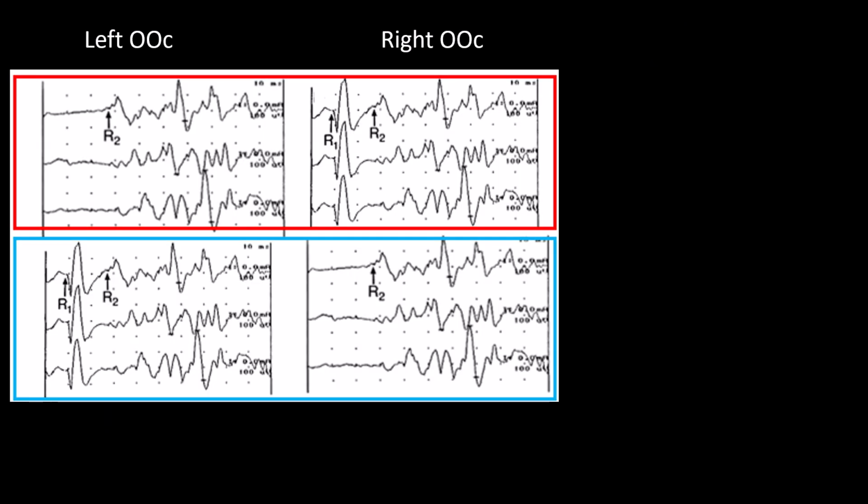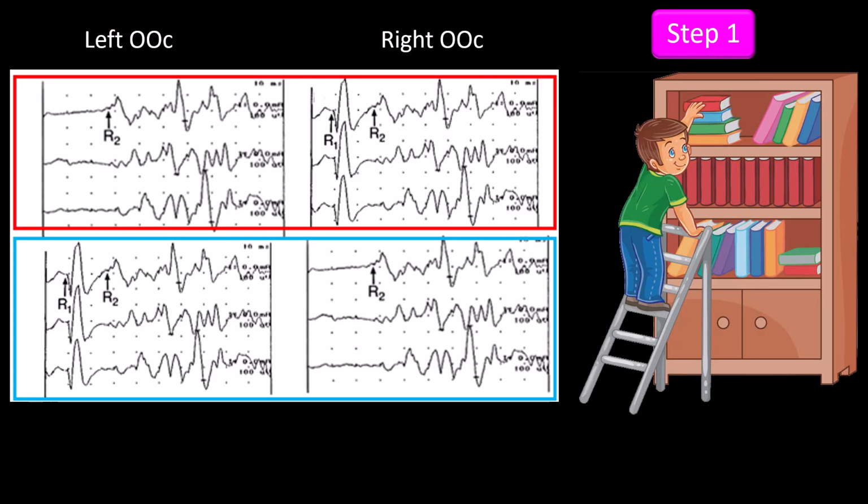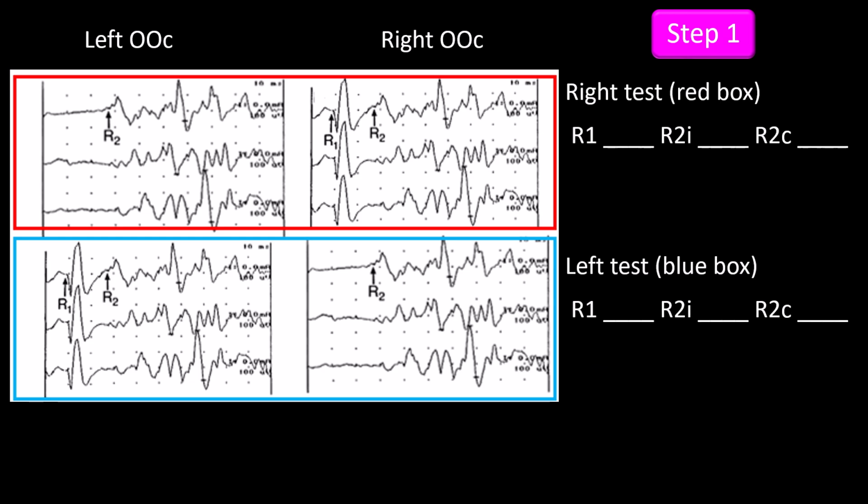This is the usual presentation of a blink reflex test waveforms. In past clinical neurophysiology board examinations, the value for each of the elements have not always been provided, but control values have always been provided. The first step when analyzing blink reflex test waveform is to create a platform that displays the results in a systematic and clear way. I find this arrangement satisfactory.